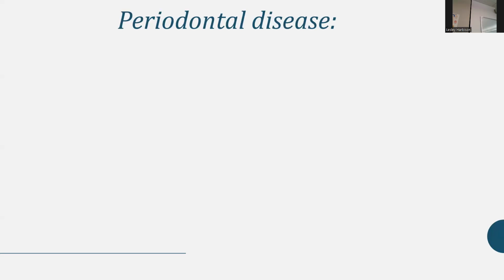So you could just as easily take a picture of this and label it. It's just the labeling. I would recommend using different colors. This band here is the CEJ. So this is just trying to mark the band where the CEJ is. Healthy is just a scotch below the CEJ, in 1.5 to 2 millimeters. So you can label a note here: healthy, 1.5 to 2. And then less than 15% would be at about this line here. And then we go into 15.